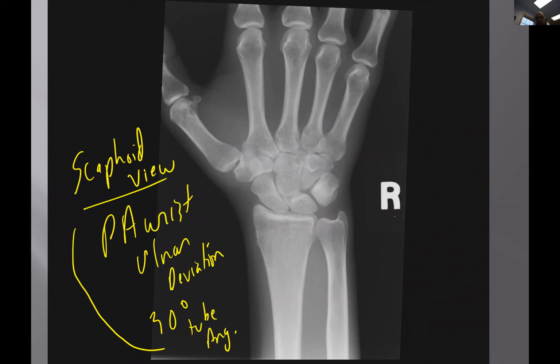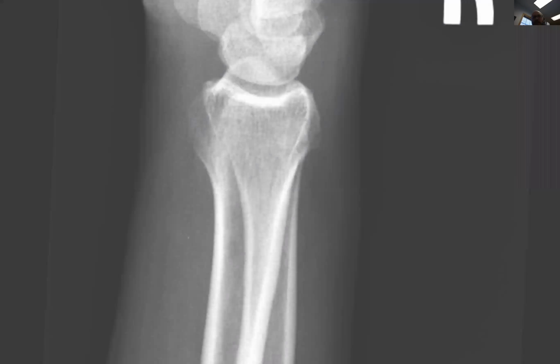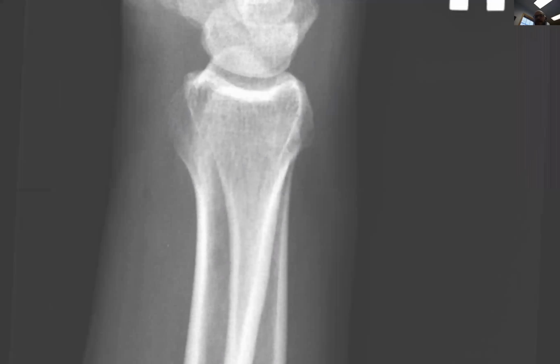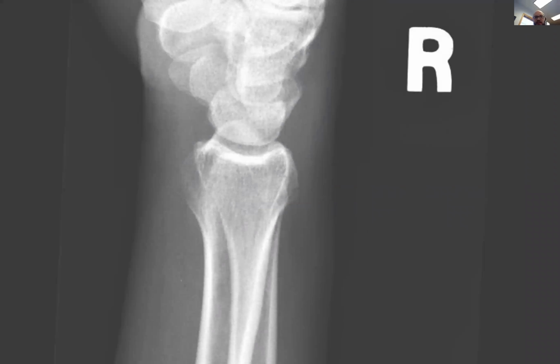Now, let me show you the lateral view. Let me blow this up. Take a look at the lateral view. Look at the dorsal aspect there. Look at the dorsal aspect. Do you see anything?